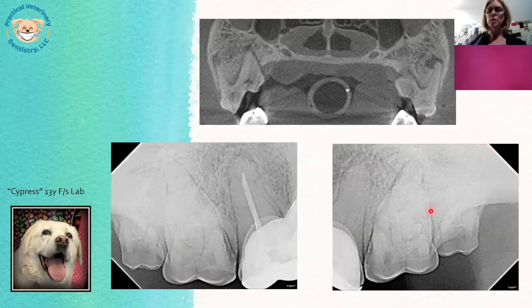So these are teeth that really looked quite normal on the radiographs, and there's just so much bone density here and so much overlap with these roots that you just can't appreciate these periapical lesions. So this is one of those cases where we're finding things on the imaging when we were not expecting it. And unfortunately, or fortunately, because I have it, I'm finding this quite commonly.